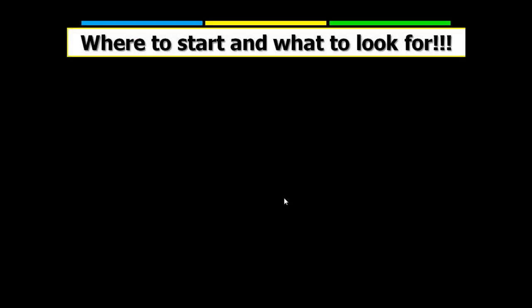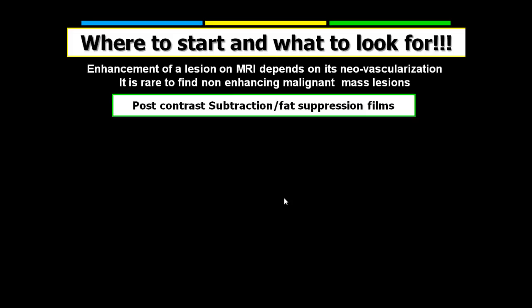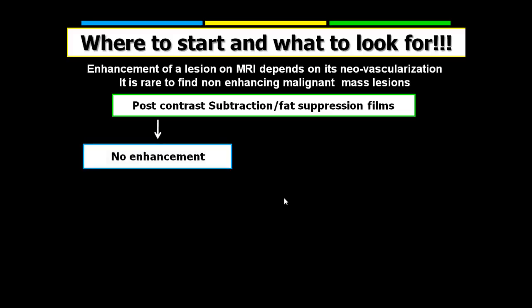After finishing the MRI technique, we're given about 6 to 8 films, and then we feel we are in a mess: where to start and what to look for. We have to know that enhancement of a lesion on MRI depends on its neovascularization, and it is rare to find non-enhancing malignant mass lesions, as we've just said. So it's reasonable to start by looking at the post-contrast subtraction or the fat suppression films. If we do not find any enhancing lesions in these films, then we have an easy job.